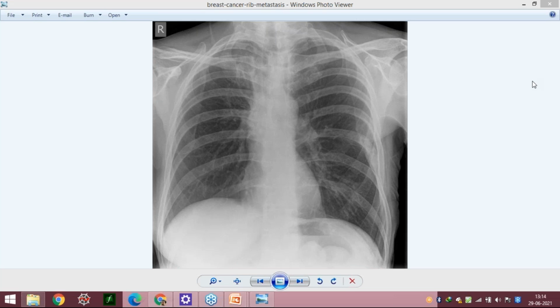How do we differentiate pulmonary hypertension and hilar lymphadenopathy? Again, before just going directly to chest X-ray, it is not easy. You have to basically go for the clinical scenarios, and based on the clinical history, you go about differentiating. Like if I go to this hilum, the pulmonary artery, if there is a dilation of the pulmonary hypertension, this area would be dilated. If there is hilar lymphadenopathy, there will be nodes here.